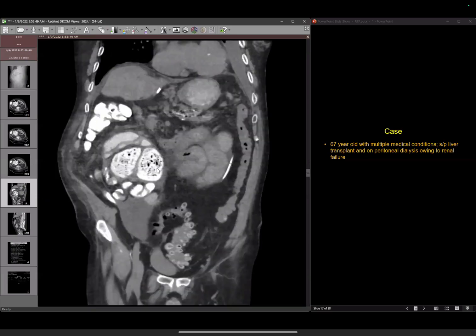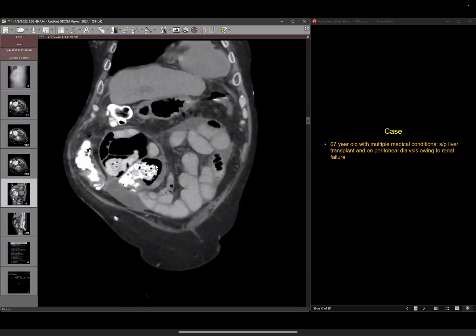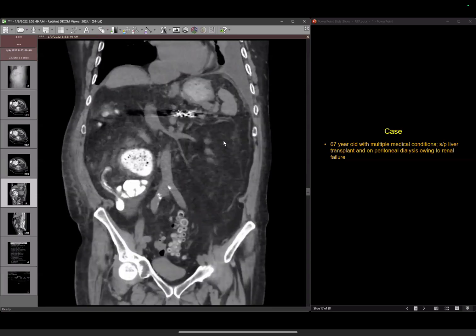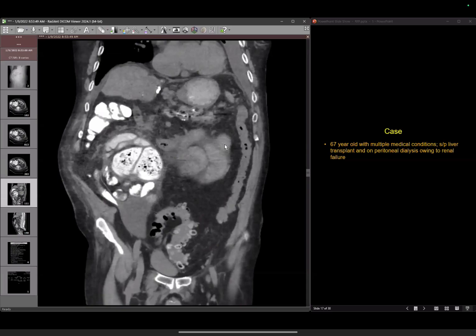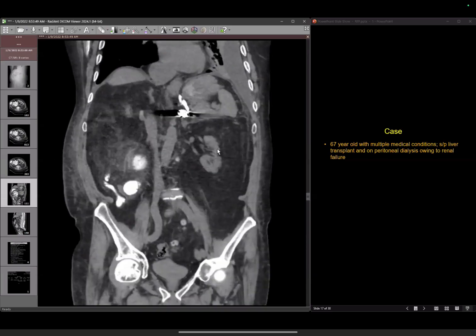So few loops are distended. It doesn't seem to be obstruction. Yes, sir. Is there a small bowel feces sign? Yes. Yeah, so remember, for you to call an obstruction, what is the one word that is very important for us in radiology?